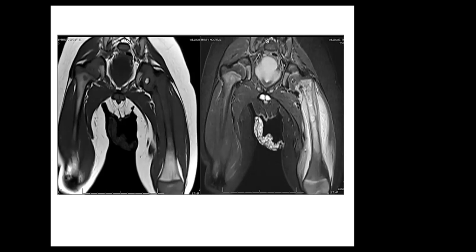With the edema involving soft tissue, and also abnormal signal intensity in the bone marrow. So we have 1 minute left.